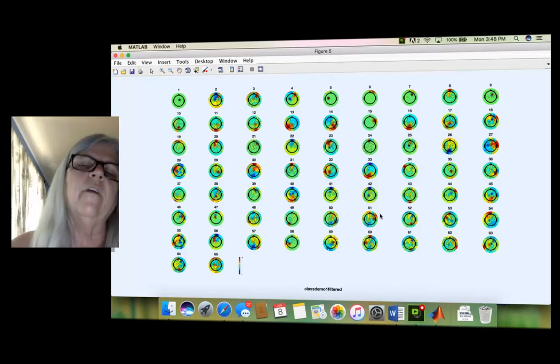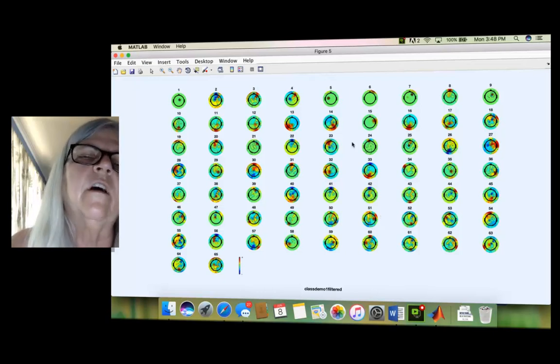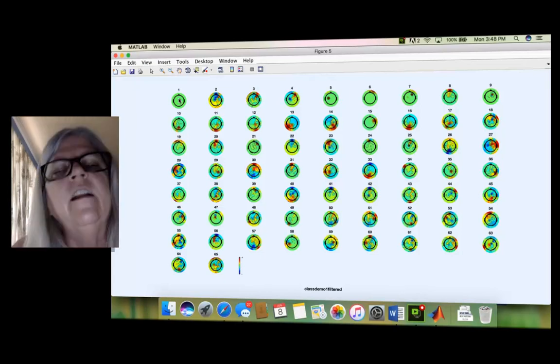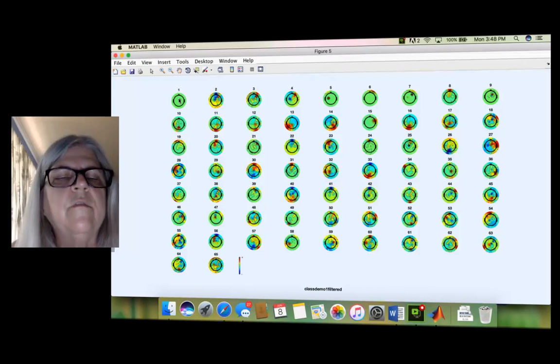Okay, now the red areas are the areas of the highest signal intensity. And you see this one where we have a signal focused in one dot. That is a highly improbable actual physiological signal within the brain. So what does a brain signal look more like?